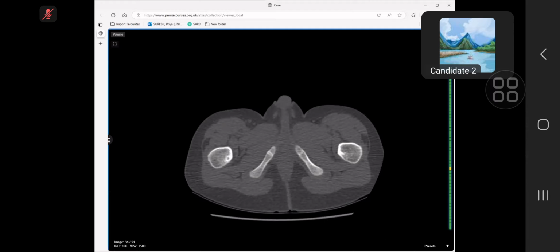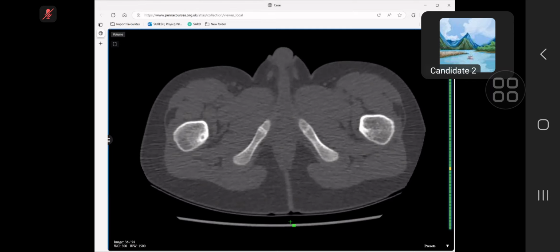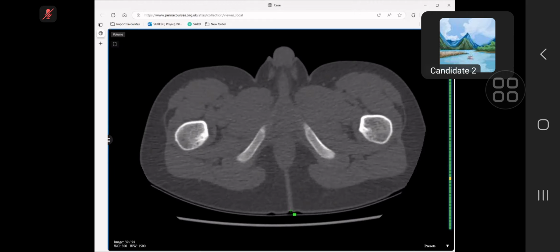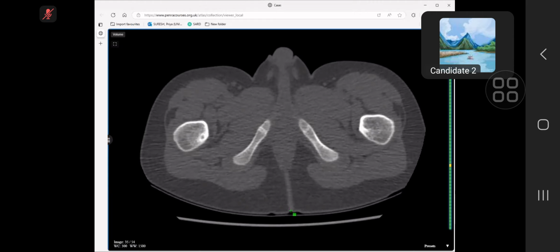I cannot appreciate any further density within it, which is typically described for osteoid osteoma, but this sclerosis with corresponding marrow edema, without any soft tissue mass lesion, without any periosteal reaction, underlying bone break, or any scalloping, is very typical for osteoid osteoma.